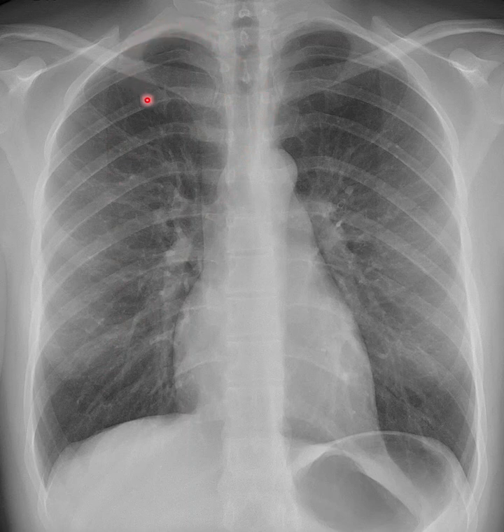So we say rib 1, then we'll come back here, find where rib 2 attaches to the spine. That's rib 2, rib 3, rib 4, 5, 6, 7, 8, 9, 10. Then a little bit of 11 here, but we need to see at least 9 to 10 posterior ribs above the diaphragm. So let's go over to the left side of the patient's body.